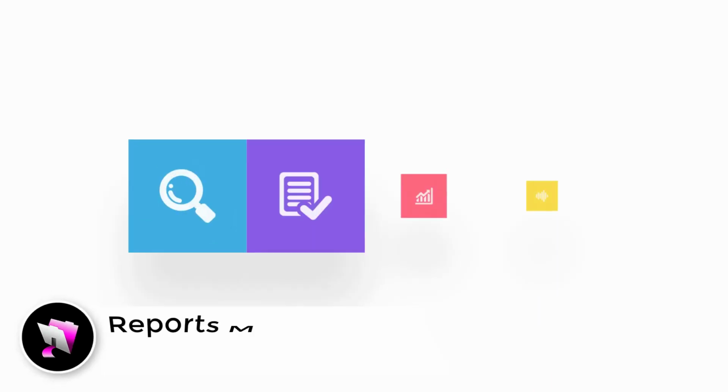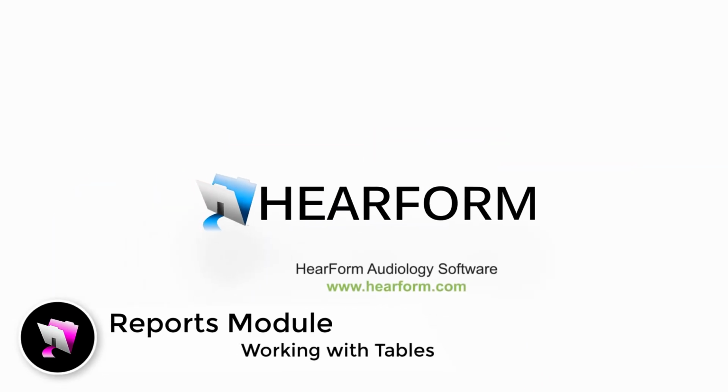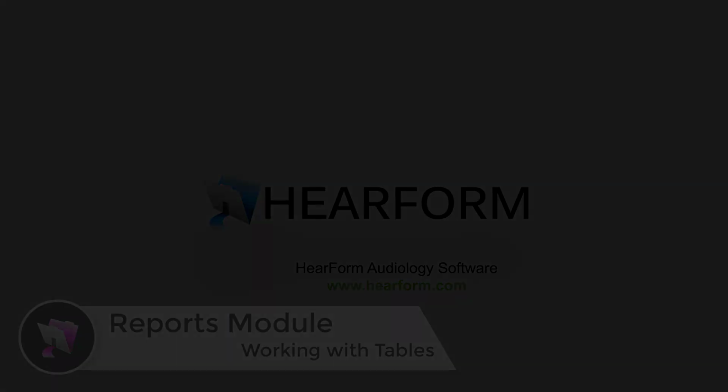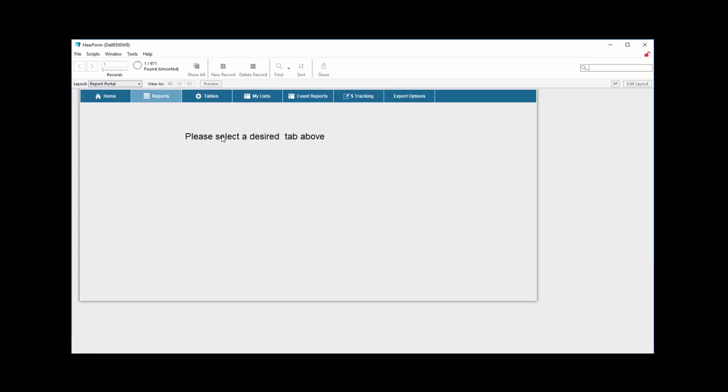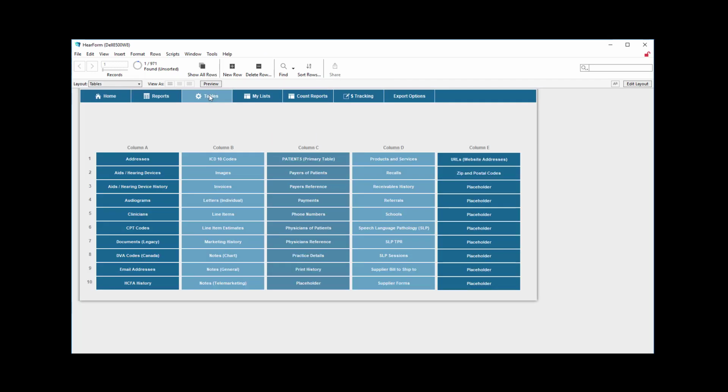Welcome back. This video will explain how to work with tables in the Reports module. HearForm Pro is a database, and a database needs a place to store its data. Let's go to the Reports area here and take a look at how HearForm stores its data.